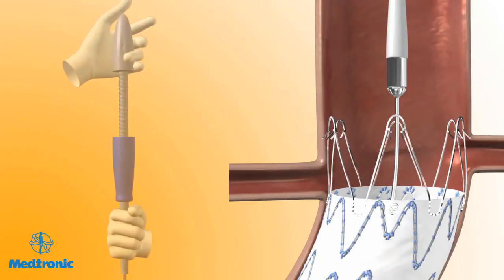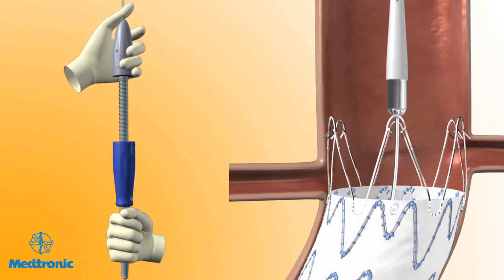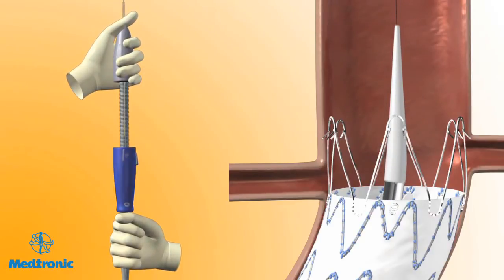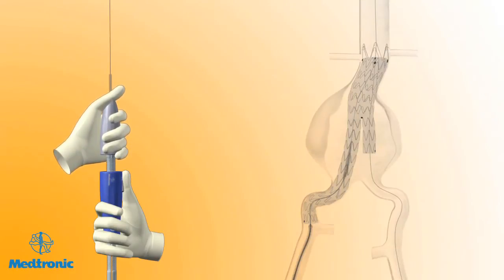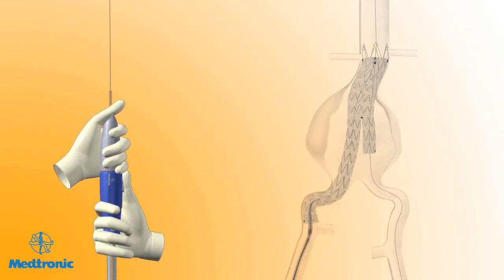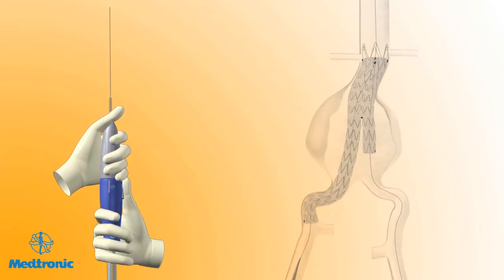To configure for removal, continue to hold the delivery system with one hand on the front grip and the other on the slider. Gently torque and withdraw the delivery system until the spindle is retracted into the fabric portion of the stent graft. Pull back the slider trigger and hold the slider stationary while bringing the front grip to the slider. Gently remove the delivery system using fluoroscopy to ensure that the stent graft does not move during withdrawal.